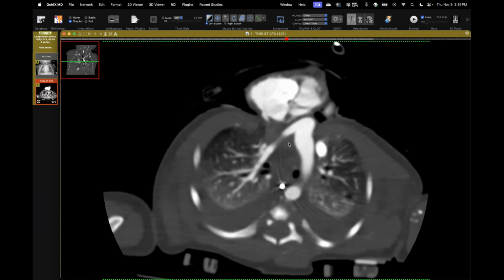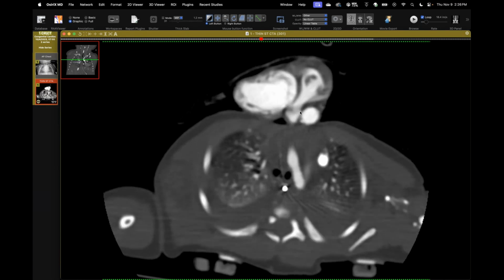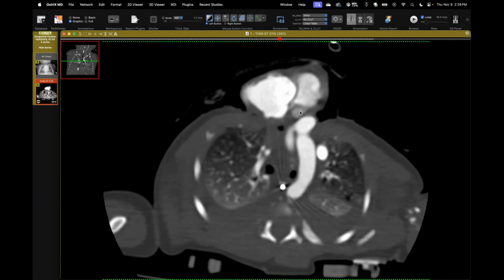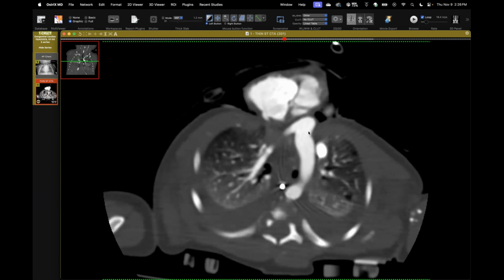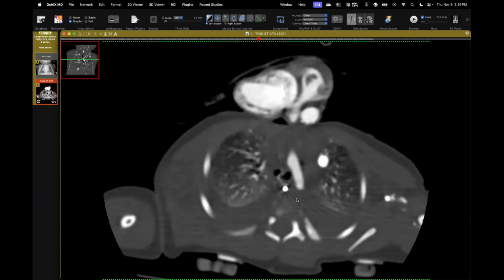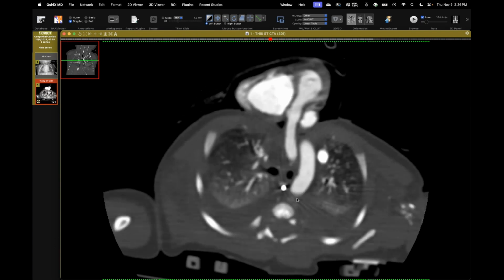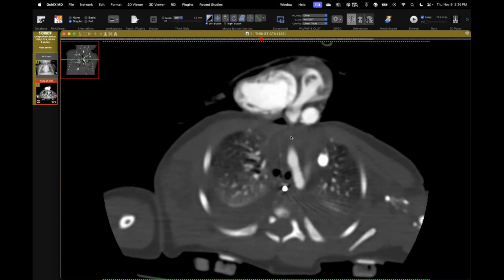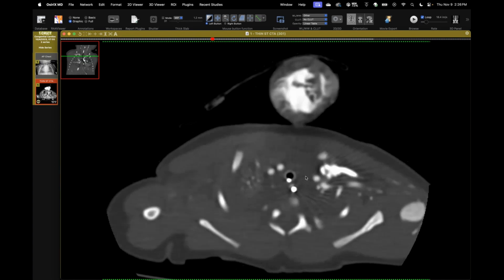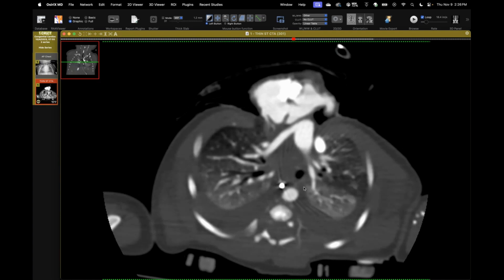And we can see there's the aorta coming off, but it's an interesting aorta because there's a PDA, and there's an interrupted aortic arch. So here's the aorta coming off. So we follow that. There's the PDA, and you can see the PDA communicates with the descending aorta off the pulmonary artery, and the aortic arch, which is here on the left, terminates in a left subclavian artery. So it's an interrupted aortic arch, and the descending aorta is perfused via the patent ductus arteriosus.